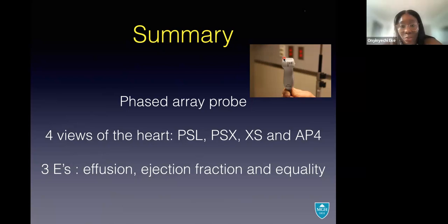It should be smaller or at most 1:1. If it's bigger, it's a concern for right heart strain. And if it is acute, then you're concerned for a pulmonary embolism. Now, it could also be chronic, particularly in patients who have a history of pulmonary disease.